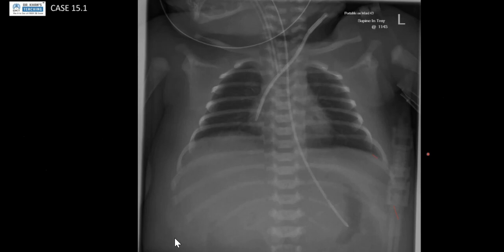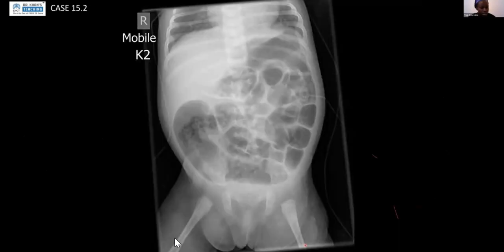Is this the intravenous line? Okay, I think it's in proper position also. I see there is a central rounded lucency in the abdomen, so I am worried about pneumoperitoneum. Okay, so that's this case. And then do you want to do this case?